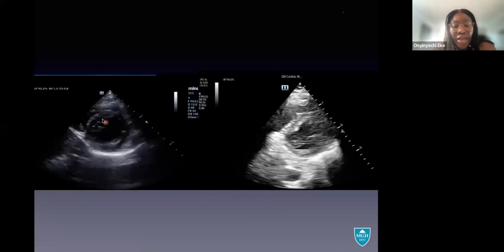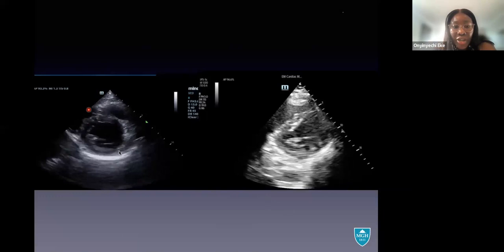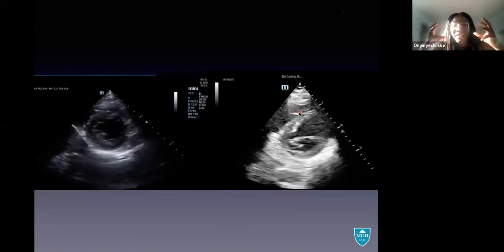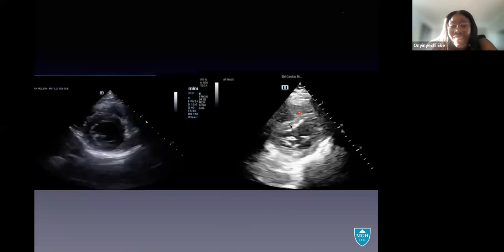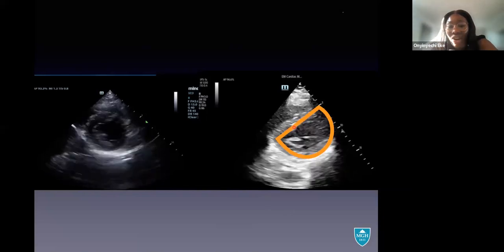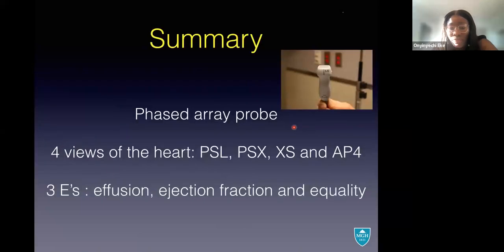What I will see, again, this is the septum. We see part of the right heart here. This is the left ventricle. When there is strain, when that right heart is big, it's going through stress, something is causing the pressure there to somehow increase, the septum is going to flatten, okay? And this is what we call a D sign. And it is a sign of right heart strain, okay?